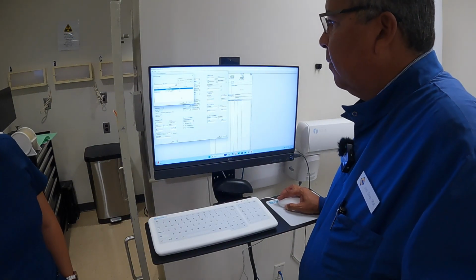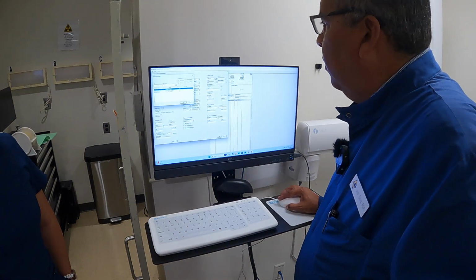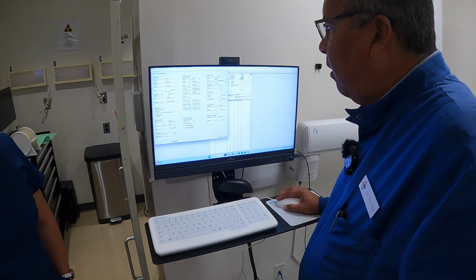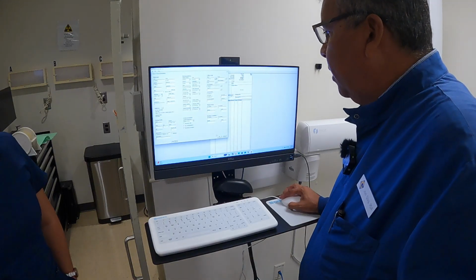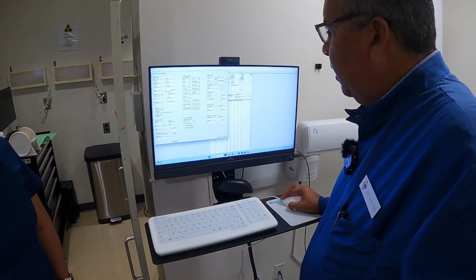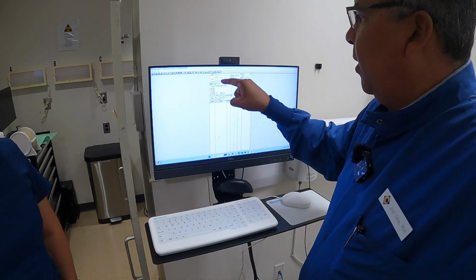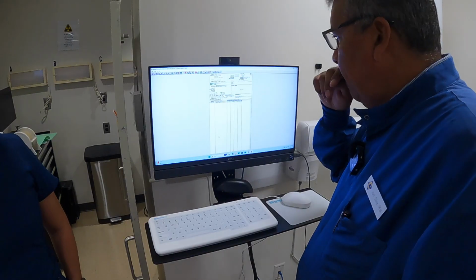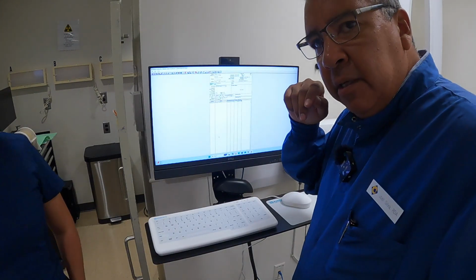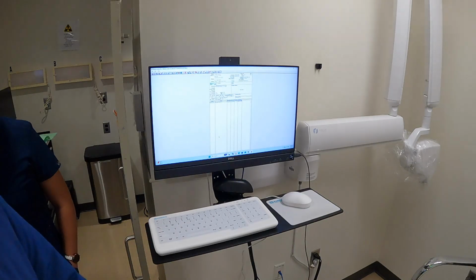Okay. Does that make sense? Okay. So then we click OK, and then that's in there. If all of this is done and this is complete, we can then press OK. And then when you do that, all your information goes up here as a regular patient in the system. Okay. Any questions on that? Okay, go ahead and complete that. Let me know if you have any problems.